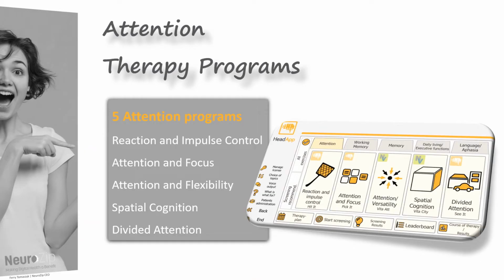Brain rehabilitation is crucial for restoring and compensating patients' cognitive decline following neurological complications or suffer from psychiatric disorders associated with cognitive deficits. HeadApp is a comprehensive and sophisticated system. This practical tool assists the therapist in the rehabilitation of cognitive disorders. By solving tasks, brain processes will be activated and important brain functions will be improved or restored. Successful training means that the user will be better able to cope with the challenges of everyday life.